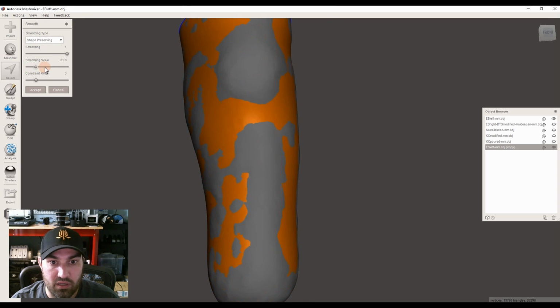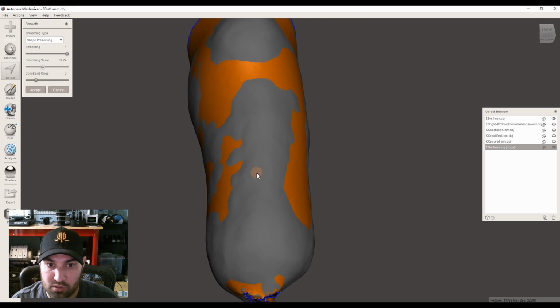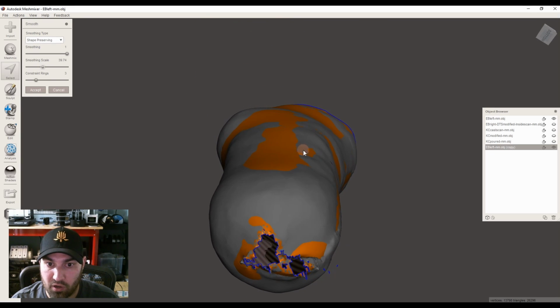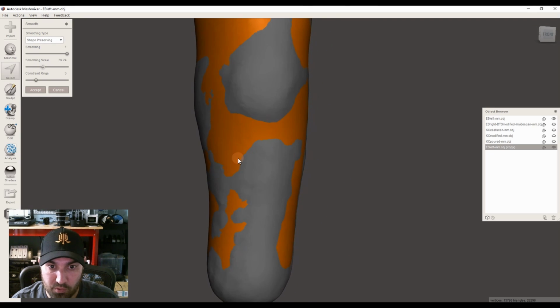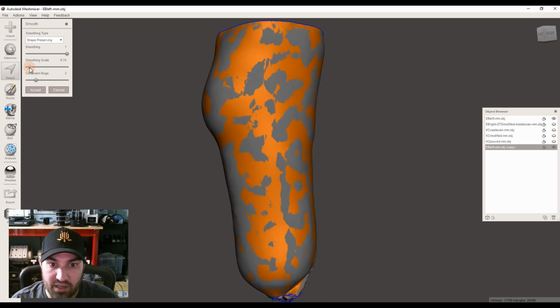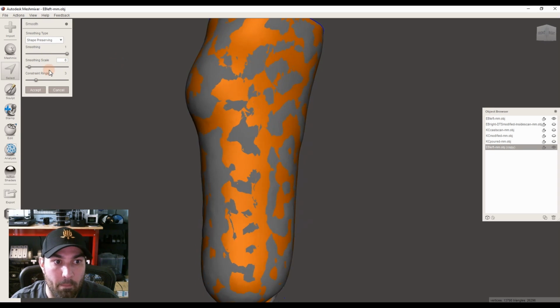You can see if we scroll up, now as that orange model has reduced, we've lost our tibial crest. We've kind of filled our indents in and the pre-tibs. So that's probably going to be too much smoothing to where we started to affect the shape. So if we stay down here, generally under 10 is pretty mild. So let's go with 6 here.